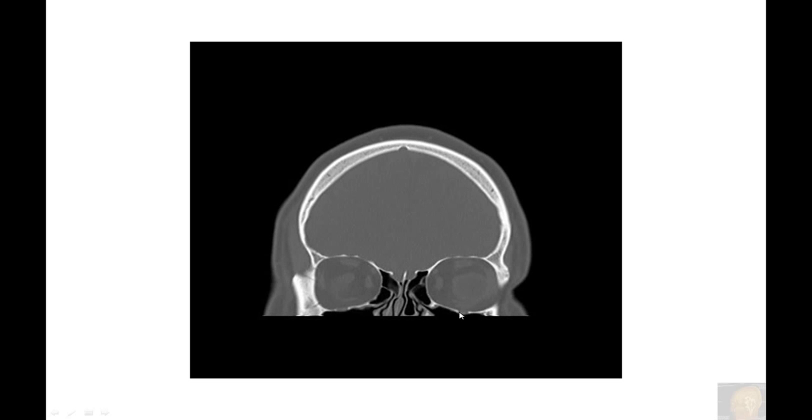Keep moving posteriorly. And these two cavities, not recess, it's basically a fossa, which is a space for the olfactory nerve, cranial nerve 1, which sends little small nerves through this cribriform plate, which is here, into the nose, which detects the smell.